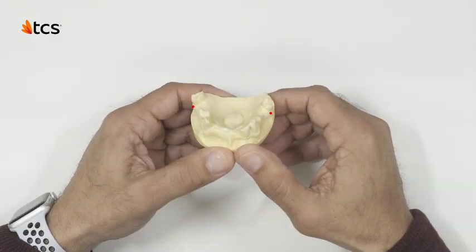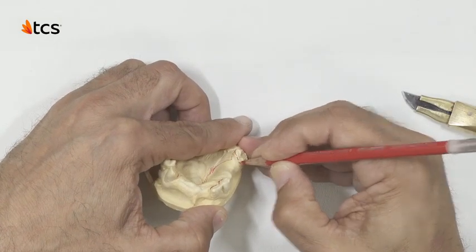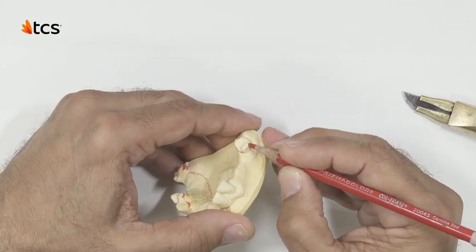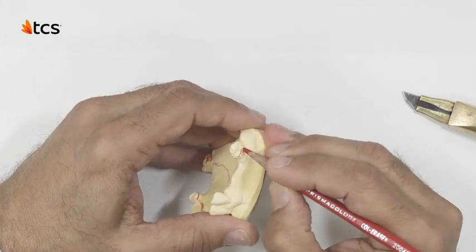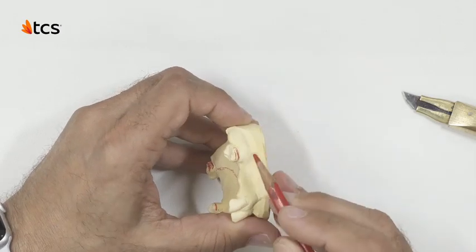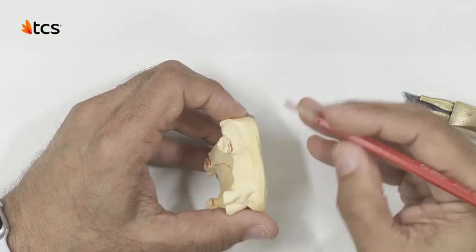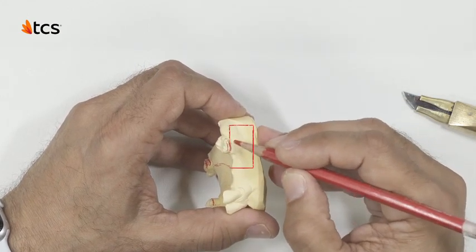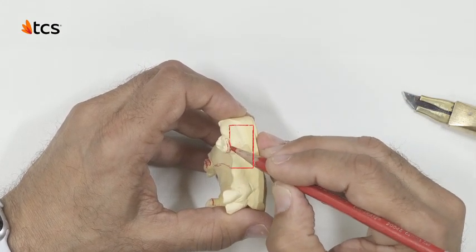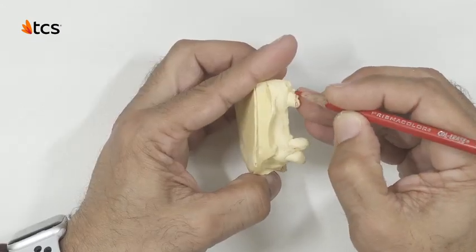As previously mentioned, the angulation of the molars creates a challenge for the path of insertion. The opposing angulations of these teeth require an extensive blockout to get through this V shape. We can avoid an extensive blockout by creating a high finger clasp design in this molar. Doing so will avoid this sensitive tissue area that can cause discomfort to the patient during mastication.